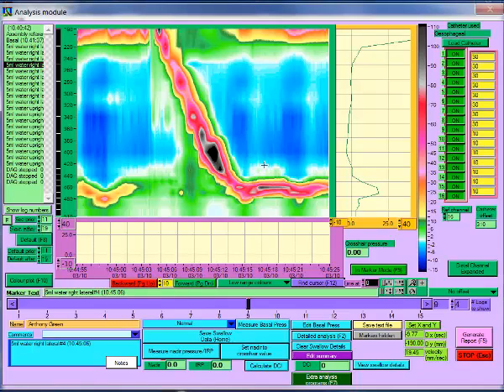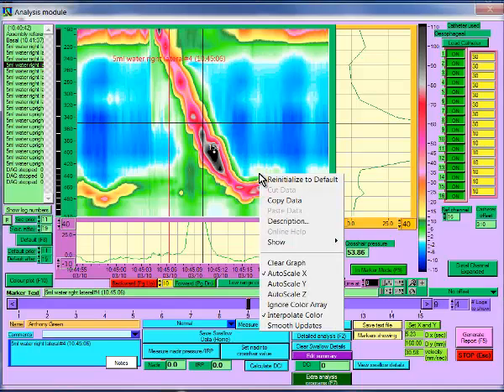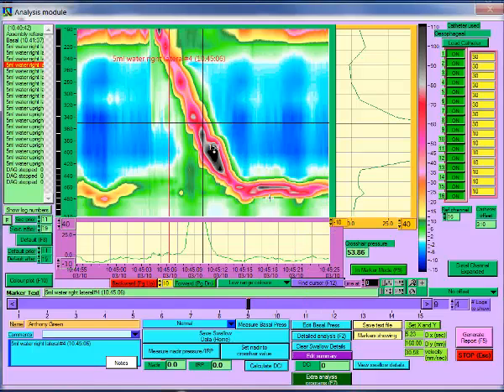You can then paste this data into another program. You may need to crop the picture within that program. If you wish to display the markers in what you copy and paste, just right-click on the colour plot with the cursors showing, copying the data with the cursors in place.